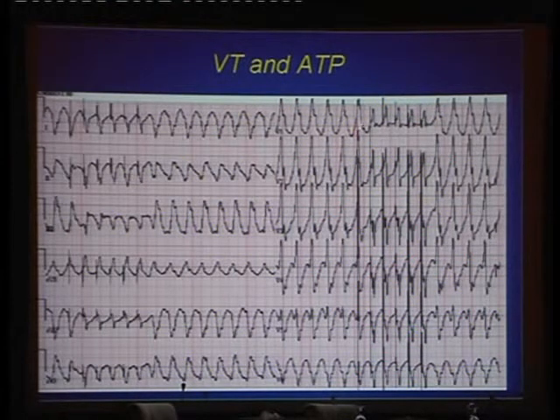So in fact, this paced beat, its wavefront, not only captured the local right ventricle and intervening left ventricle, but actually got into the circuit because all the subsequent beats are equally fused. So it meant that we've entrained it with the very first beat, but we're unable to terminate it. Who cares? Well, it's cool. That's who cares.